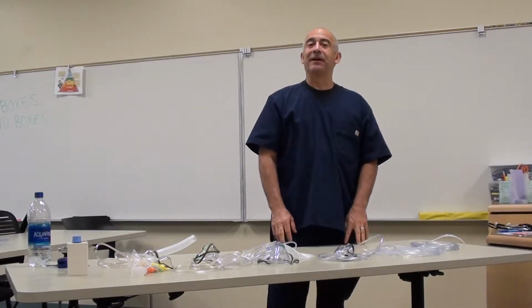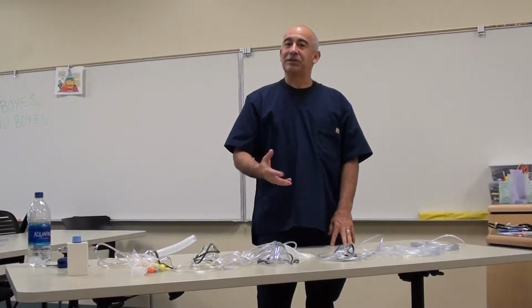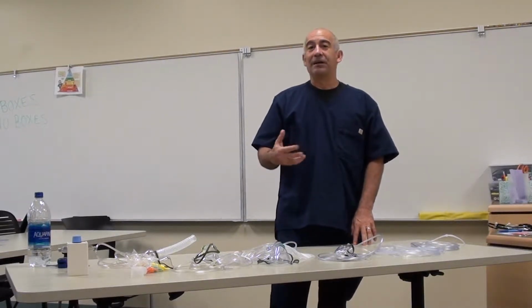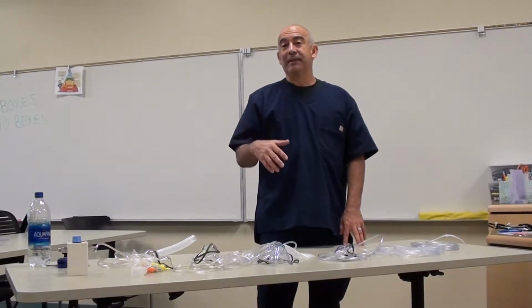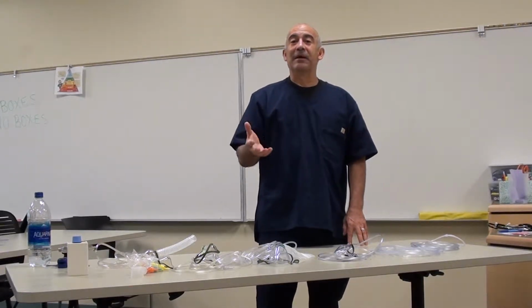Oxygen therapy delivery devices are used to deliver supplemental oxygen to patients who need more oxygen than room air delivers. For example, room air delivers 21% oxygen in the air that we breathe. The term that I'm going to use throughout this presentation is FiO2. So the FiO2 of room air is 21%.